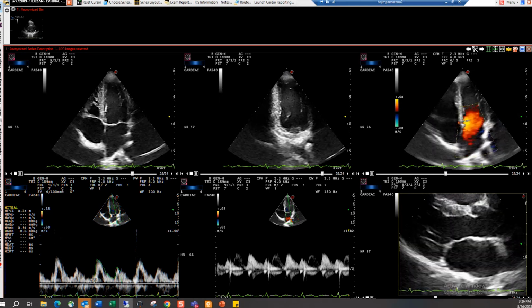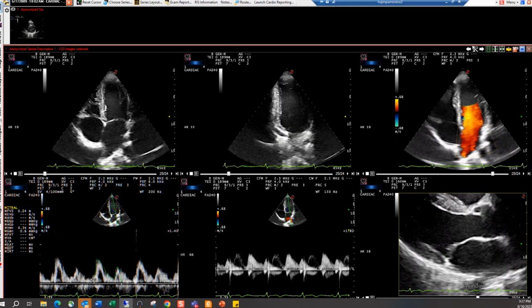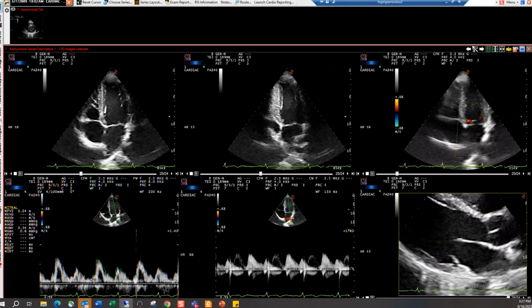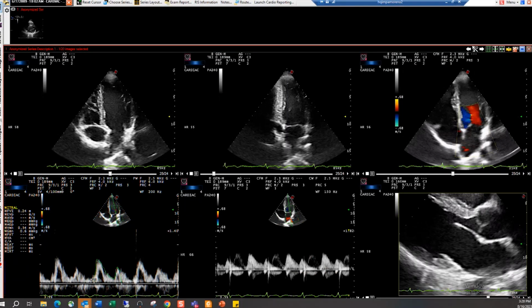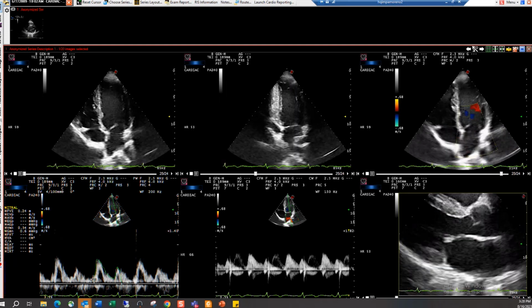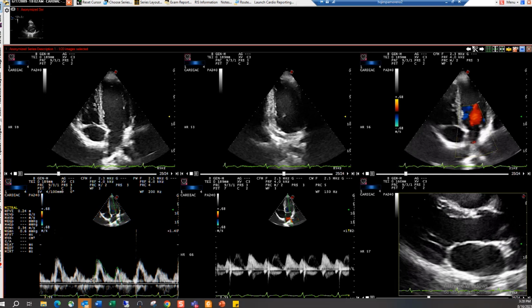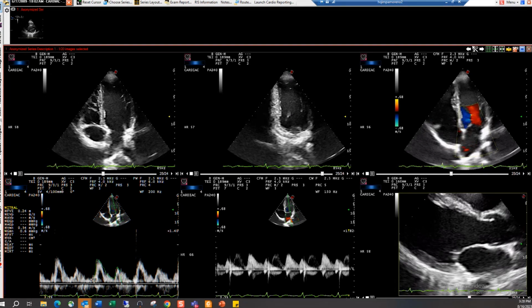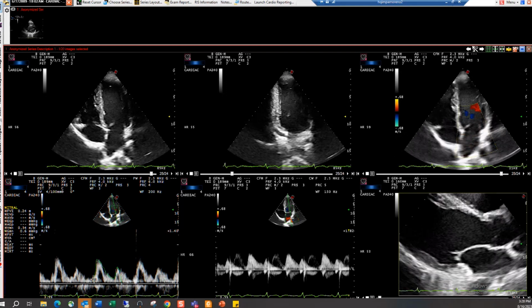Hi, everybody. I hope everybody can hear me. Yeah, Encapture can work with different workflows. We've had organizations where the sonographers do not create preliminary reporting. They do the echo, they send the echo over, and then the cardiologist would open the images, want to report, launch cardio reporting, and that would actually open the study in Encapture. So you only have one work list that you have to work from.